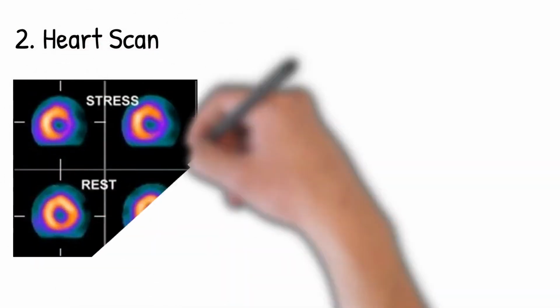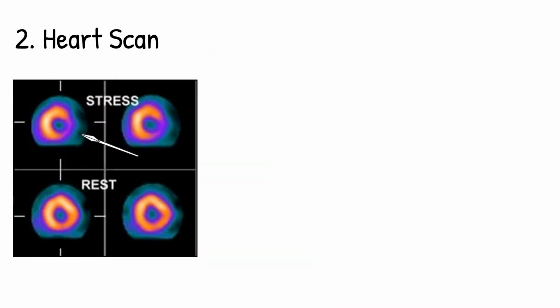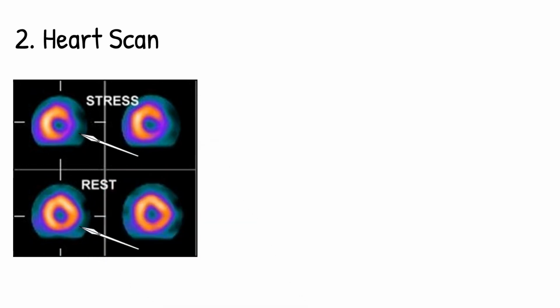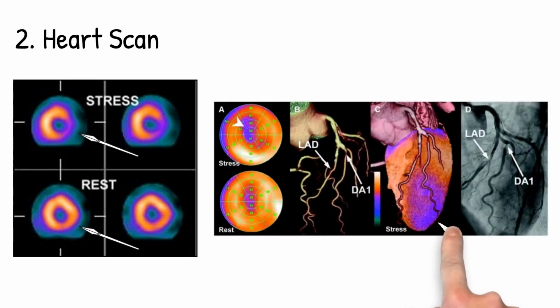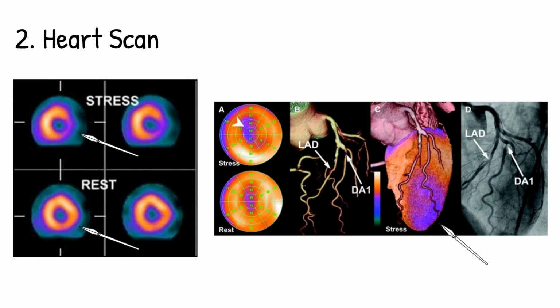Heart scans are also common nuclear medicine procedures. Here you can see a myocardial perfusion scan under stress showing a defect with the arrow that under resting conditions has no defect. So this is stress-induced ischemia associated with coronary artery disease. You can also do a number of other types of scans, including for heart failure, amyloid, cardiomyopathy, congenital changes. And some of the state-of-the-art things that we do is providing co-registration between our myocardial perfusion scan and our coronary artery blood flow studies using angiography.